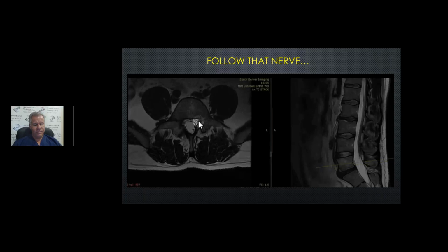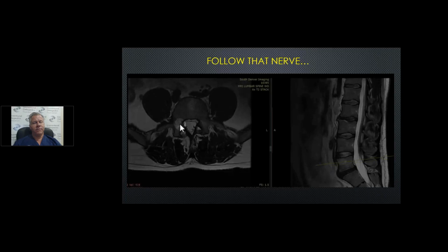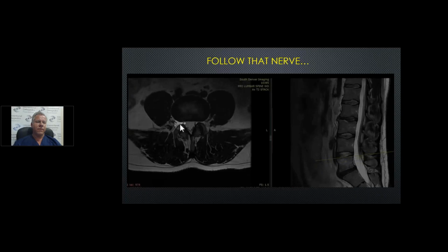Again, these L5 nerves are going to go inside. They're here and here. We're going to get into the subarticular stenosis area, the area that is right behind, or anterior to, right in front of the facet, where you can have nerve impingement. Now we're going to continue up, and eventually we're going to see an L4 nerve here. L4 nerve, right there and there.